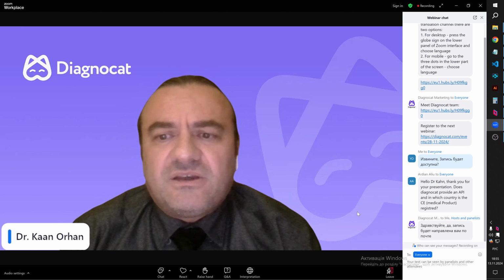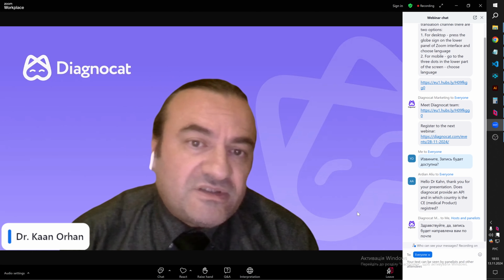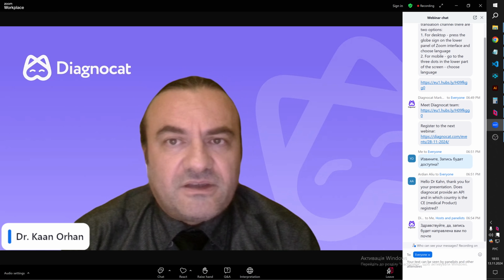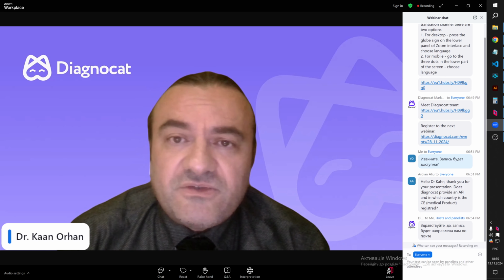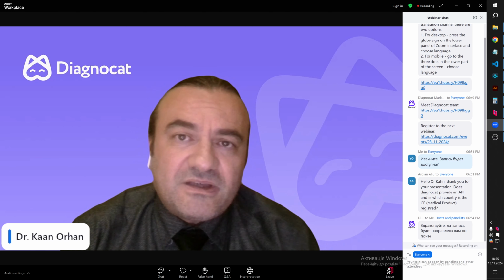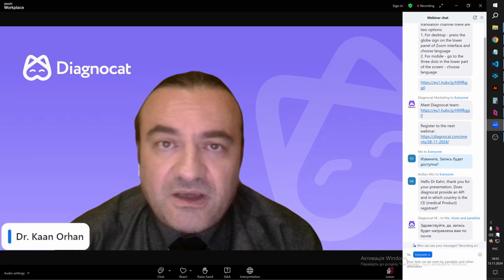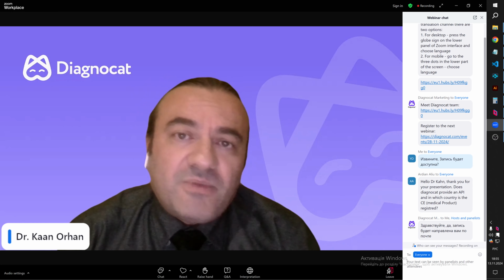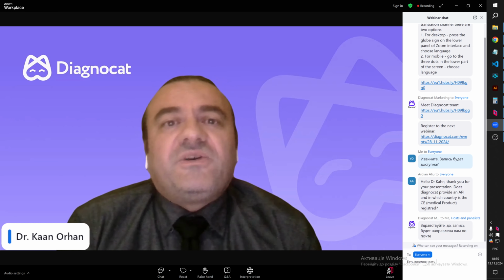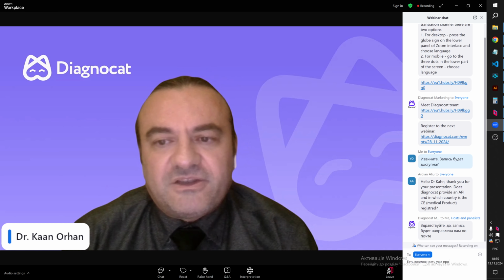So these are two examples of how we can use DiagnoCat with the medical history of the patients, especially for systemic diseases. But nevertheless, there is a huge variety. Remember, I showed you the case of schwannoma. I didn't even recognize it from the slices of the CBCT. But when I saw the 3D, I thought, all right, there's something happening. Then I took an MRI, and later on the biopsy turned out to be schwannoma. If I didn't have the segmentation, it would have been a misdiagnosis.